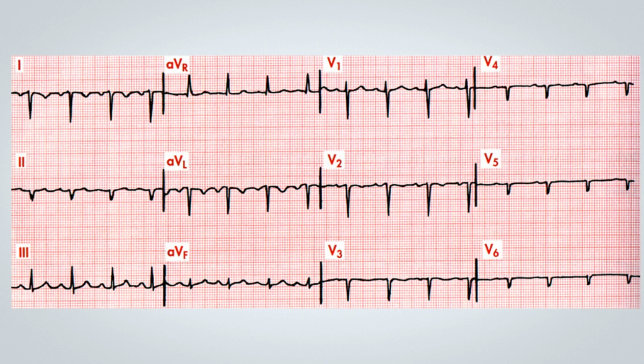If we take a look, we can begin to notice that it does not seem to be a sinus rhythm at first glance. We have a negative P wave in D1, right? So there's an atrial rhythm with a negative P wave in D1 and a seemingly normal PR interval. However, when we examine the QRS complexes in the limb leads, we can already see a completely deviated axis. We have a negative D1 with a positive VF, meaning that the axis is deviated to the right.